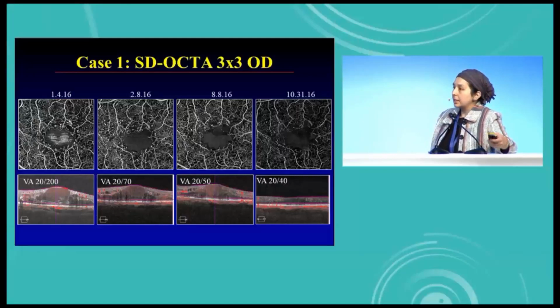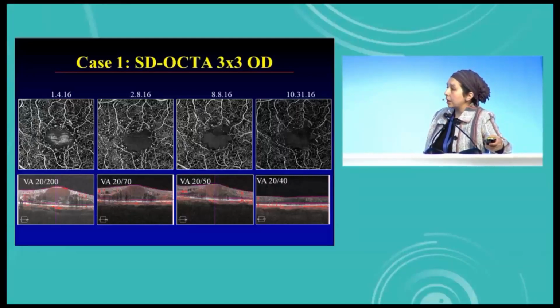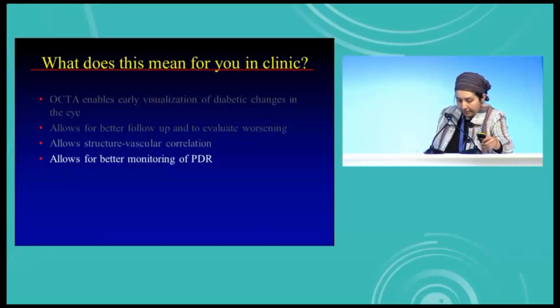So, this nice structure-function correlation means that you don't necessarily have to resort to fluorescein angiography again and again on these patients, as you would have to do if you were stuck with this patient 6 months later with suboptimal vision.